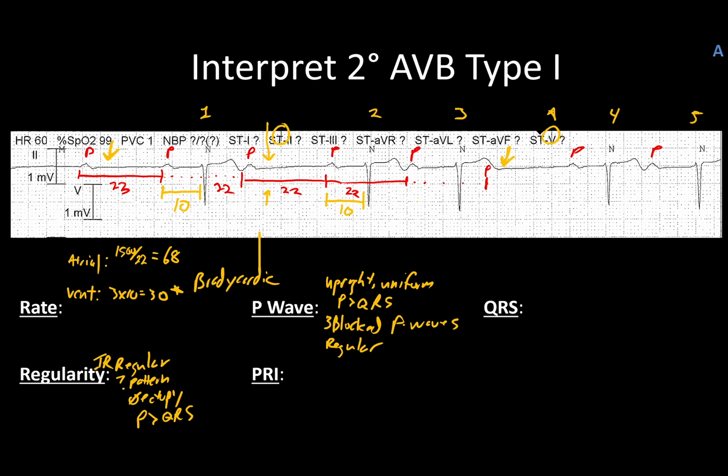But now, because we didn't drop a beat, we can actually measure from here to here, and that gives us 13. Then we have a drop, and then we'll measure again. It comes out to 10. And fortunately, we can measure again, and gives us 13.